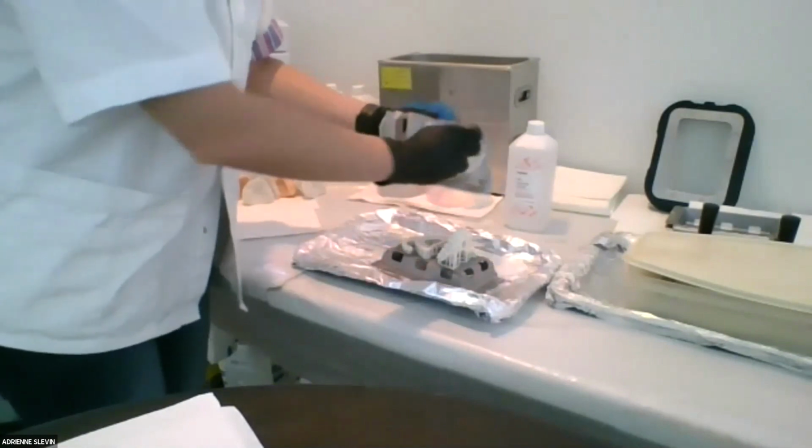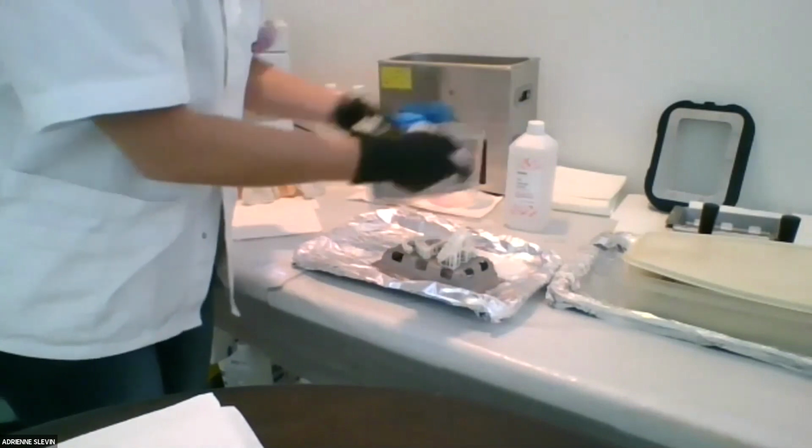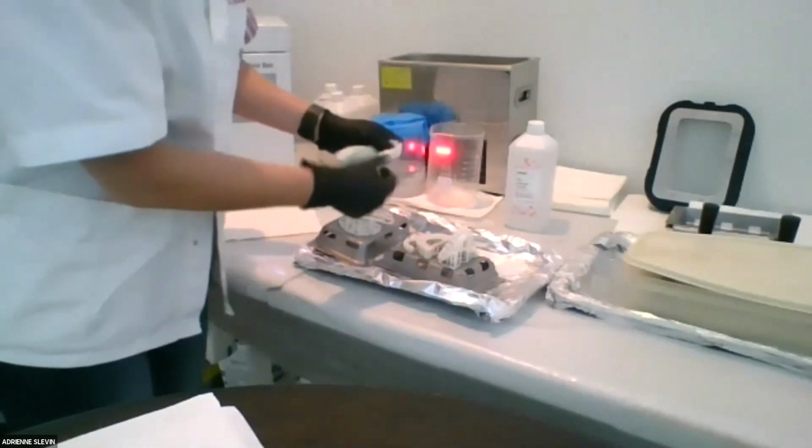And that's why Matt doesn't see a lot of scarring at all, because you see how fine tipped this is. So you just rub off those supports, and you'll put it in a dirty IPA bath. You can keep using it.